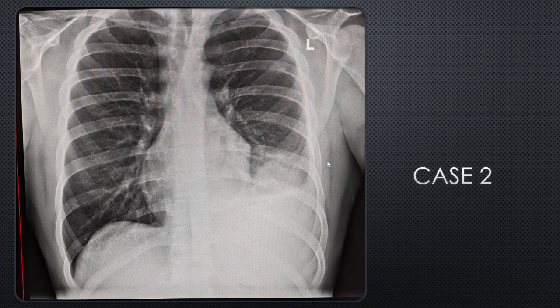And so this is case number 2 that I have, the last one of our CT section, and this actually is a 17-year-old gentleman with infective symptoms as his presentation. And this chest x-ray, if you would like to pause, you can have a read, and I'll give you some insight into it shortly.